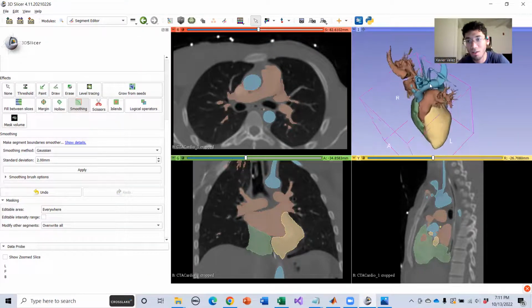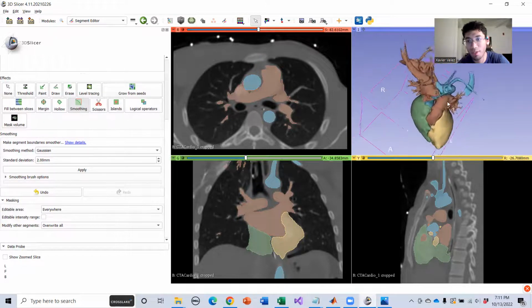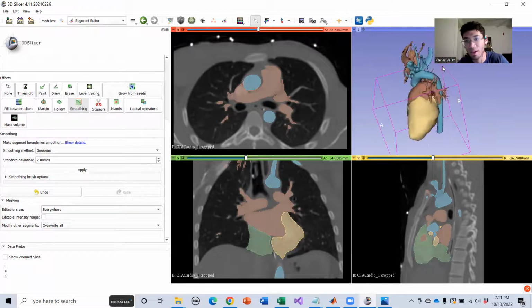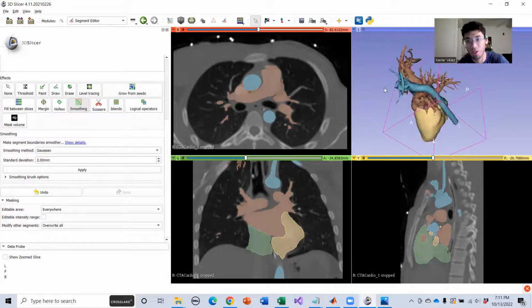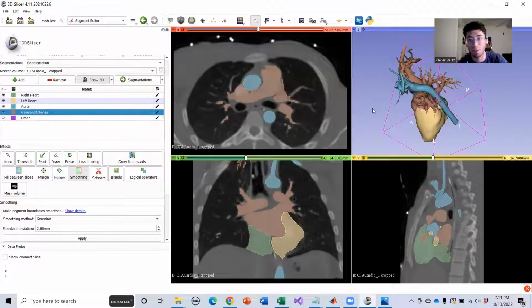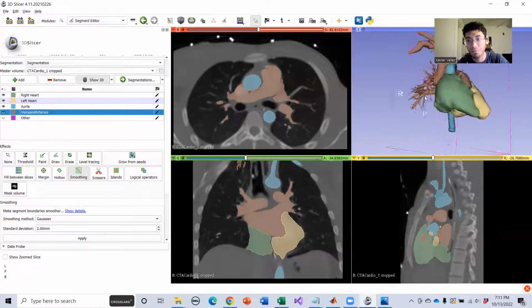Okay. You know what? I'll take it. I like it. It's a little weird, but I like it, we'll get rid of all that stuff up there. If this stuff up here is something you need, then obviously undo the smoothing filter, and find a setting or a filter that works. But just for this, we don't really need all that stuff up there.